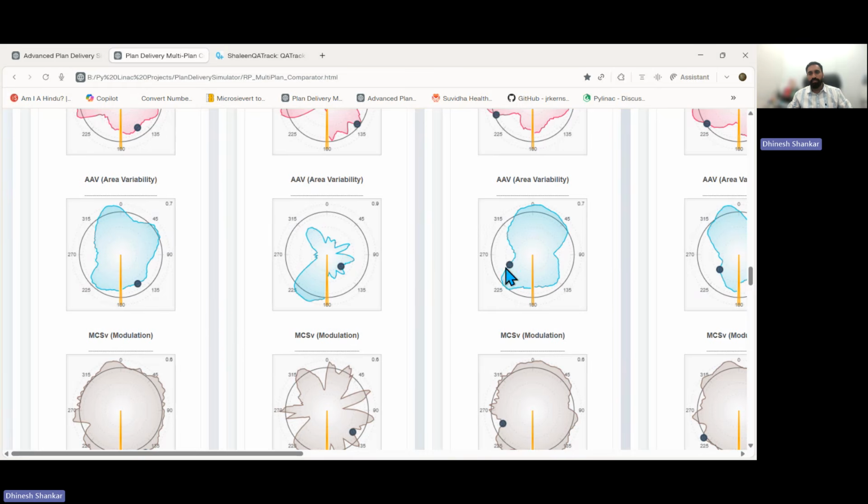For this particular plan, it was so gradual. There is no rapid spike and no sudden increase. This kind of plan seems okay.